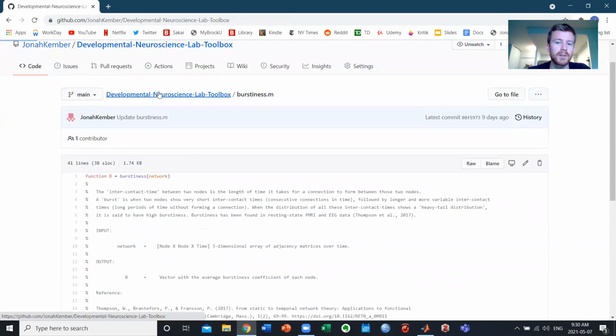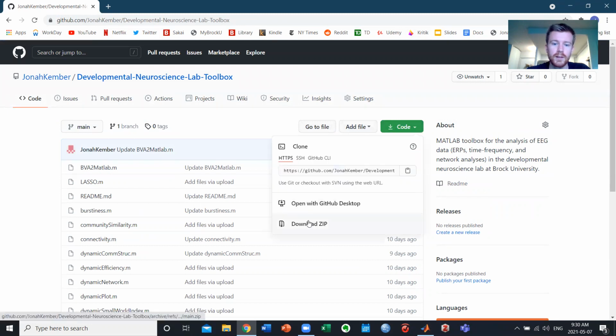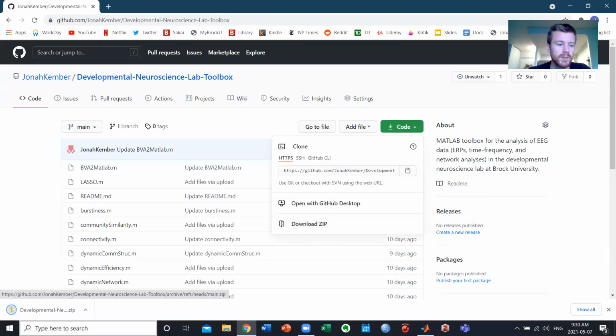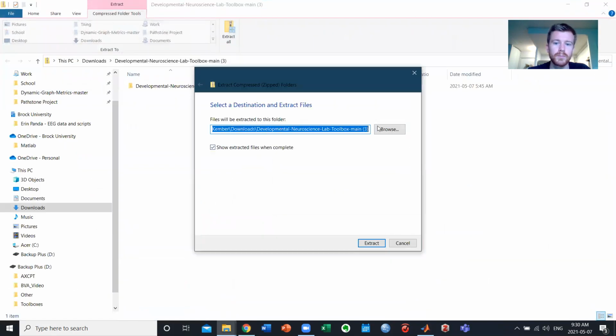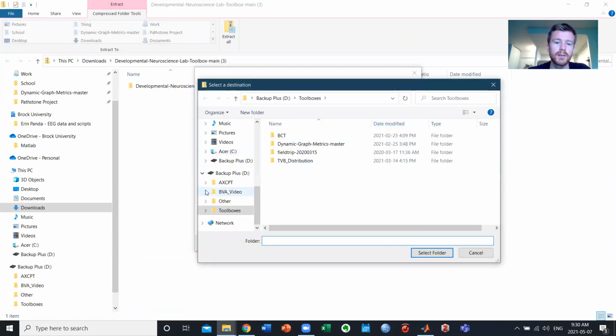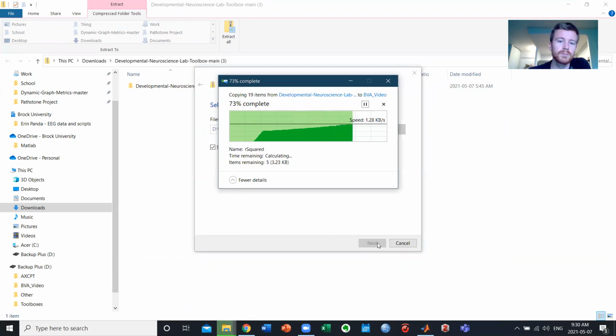And essentially what you're going to want to do is download, just like we did for Field Trip, all of these functions, and you can just extract it to somewhere useful. So I'm going to put it into the BVA video spot. Perfect. It should only take a couple seconds.